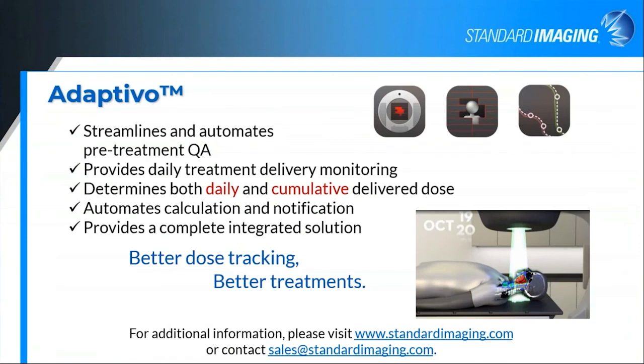So just to summarize, Adaptivo really is designed to streamline and automate your pre-treatment QA, to give you that daily delivery monitoring, both with the exit image and with the 3D calculations for the daily and cumulative delivered doses. Everything is automated as much as we can in order to make this a streamlined process for you, so that you spend your time actually looking at data to make decisions with that data, rather than shuffling files around and saying calculate and then waiting for things to calculate.